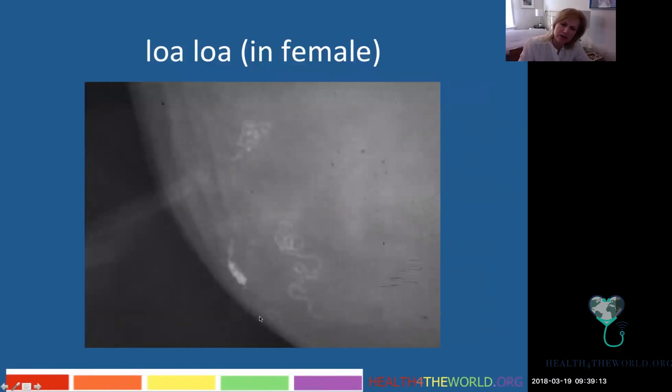It can be tricky sometimes because the linear calcifications, if they're not serpentine like this, might look like linear calcifications of ductal carcinoma in situ. You would want to try to make a differentiation there.